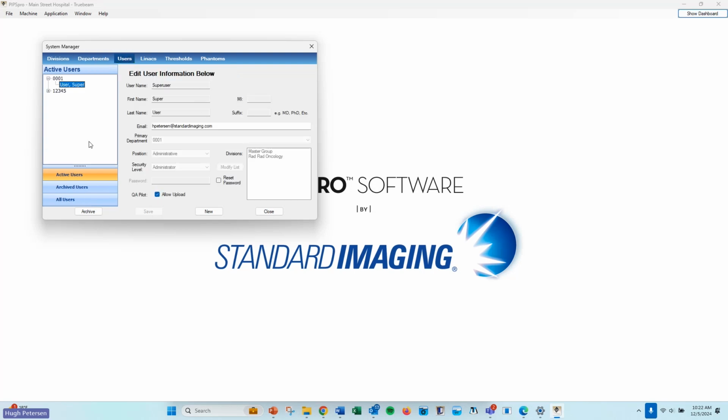Users, this is where you set your users up: first name, last name, username, email, department. Here's your position and your security level. Administrator gives you access to be able to do anything within the software, whereas a lower security level may only allow the personnel to do the testing and not do any analysis, any trending, or any changing of parameters within the system manager.